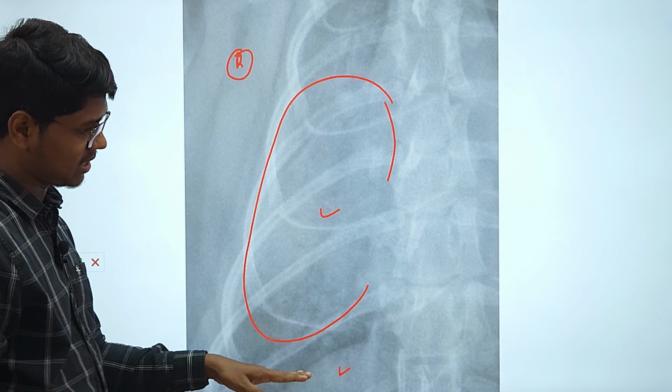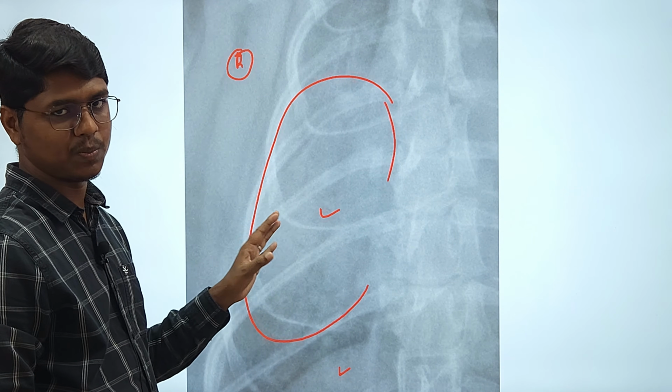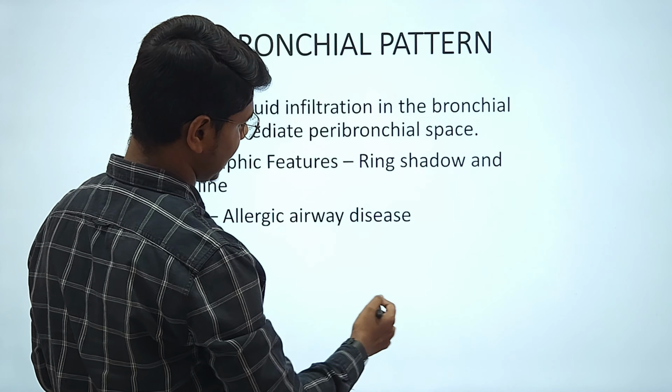Okay, it is the same as that of this diaphragm. So nearly they are the same. They will have a soft tissue opacity and they are slightly intense. Okay, when you see the unstructured, then you can slightly relate.